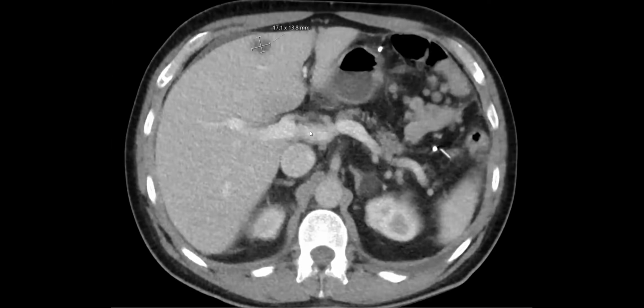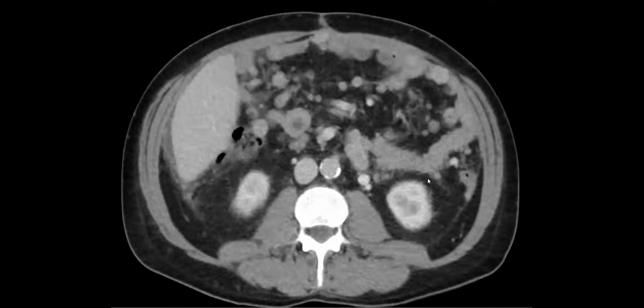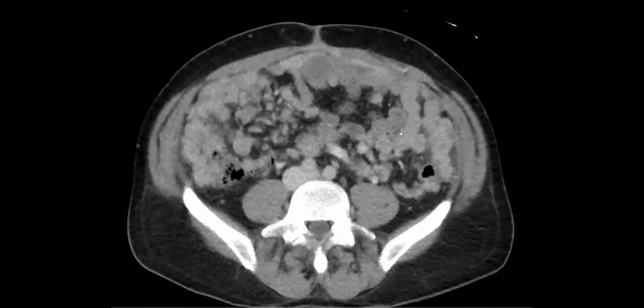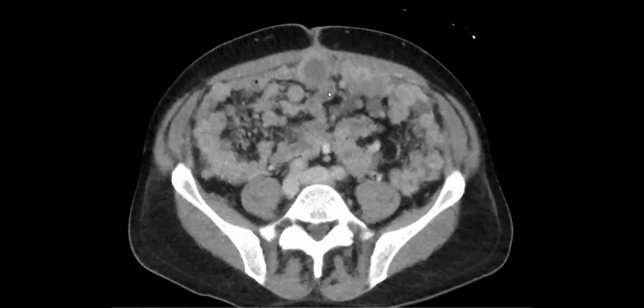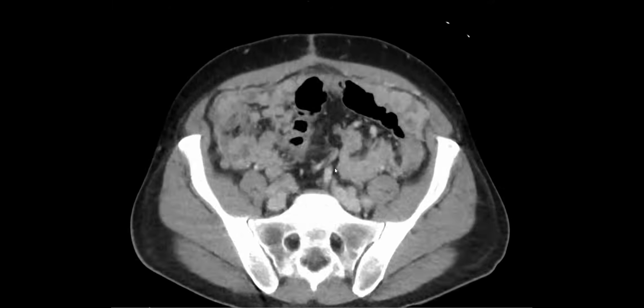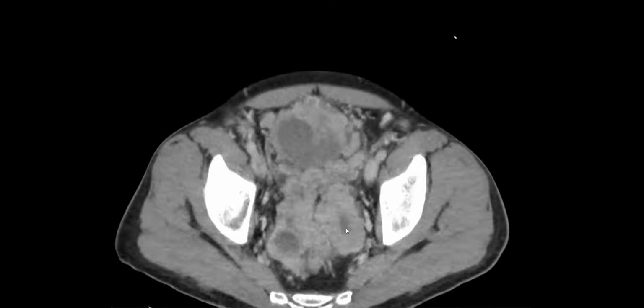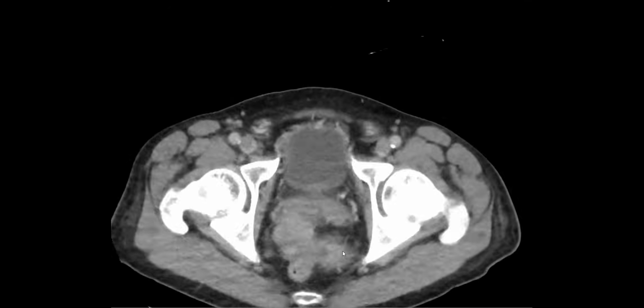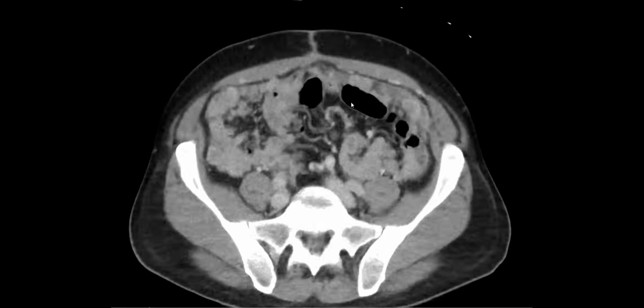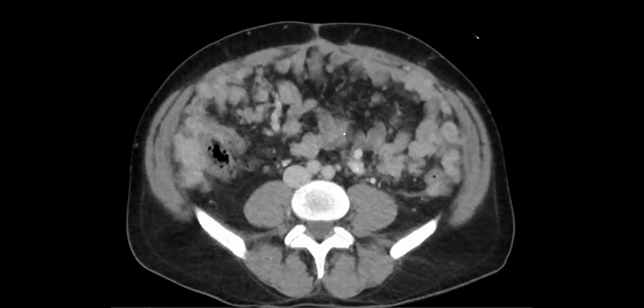And so there are liver mets. And then there's extensive peritoneal disease, kind of mimicking bowel, but you can see that all of the fat is filled up with all of this peritoneal disease. There's even larger masses in the pelvis. So this is following the typical pattern of what we expect from an aggressive small bowel GIST.